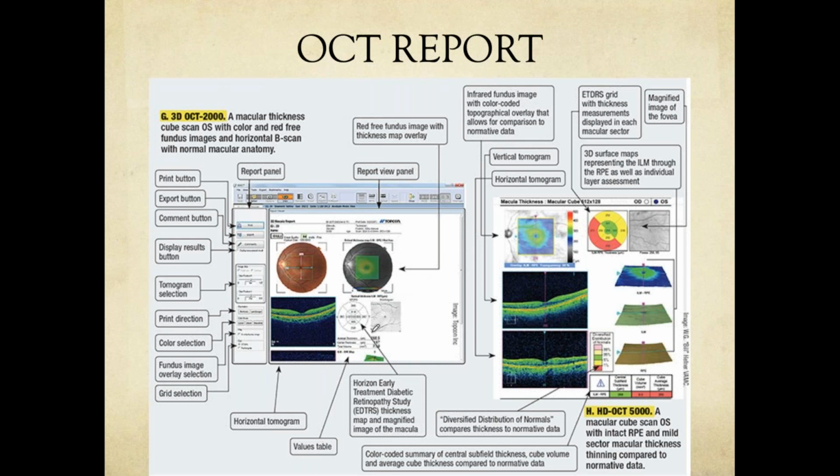What you see over here is called a shadowgram. Shadowgrams are images produced by the shadows of the structures. So even if you are not able to find microaneurysms here, you might be able to find some of them here.